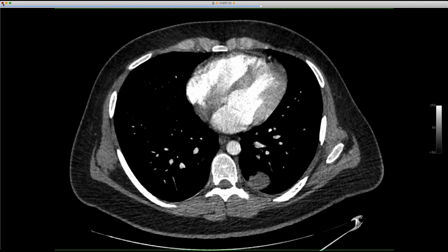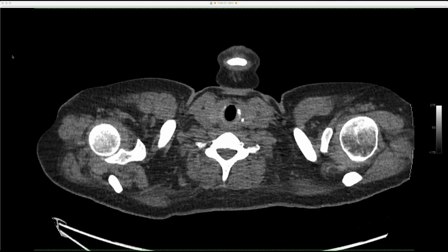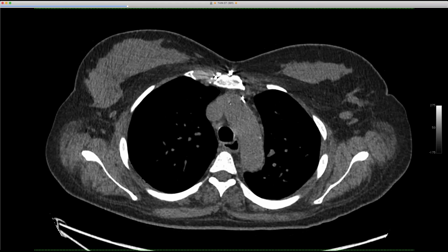Cool. Alrighty, and then one last interesting case, and I don't have a final diagnosis on it, and I'm going to make sure you're actually seeing the right images. So this is a young woman who carried a diagnosis of myasthenia gravis proven by autoantibody. Had a thymectomy many years ago. I don't have her original imaging, but she never had a thymoma, just had thymic hyperplasia, and was presenting still with some weakness. And so this CT was done to look for recurrent thymoma following surgery. And you see there is some residual thymic tissue here, but we didn't see a mass.